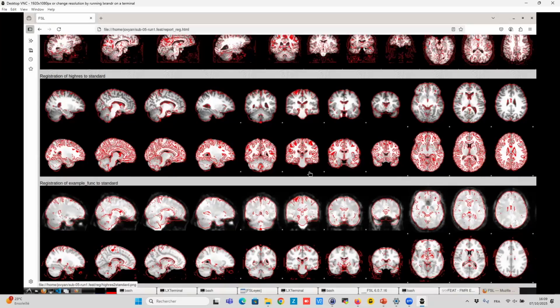And again, we did just an affine registration. I didn't go to the nonlinear registration, which is really changing the shape of the brain to match the standard space. So you have functional data and we overlap it with T1. And then the T1 goes to standard space.